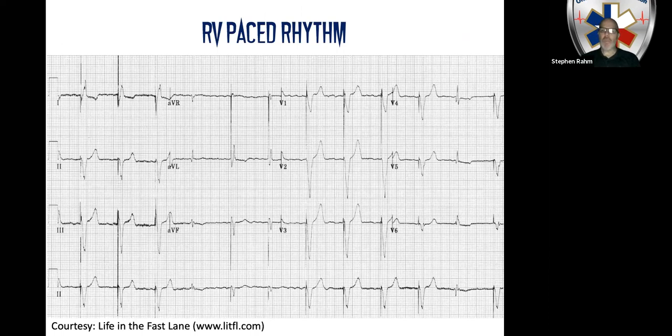and I think that's where most pacemaker wires are embedded, in the right ventricle, a right ventricular paced rhythm is going to assume a left bundle branch block morphology. And if you look up here in lead V1, you can tell that you have a terminal S wave. Again, if I put a horizontal line through this entire QRS, the first complete triangle I would make is pointed down. So this gives you a left bundle morphology in lead V1, V2, and V3.